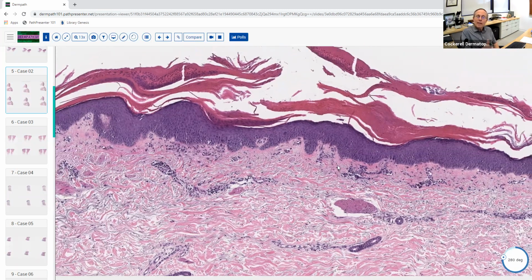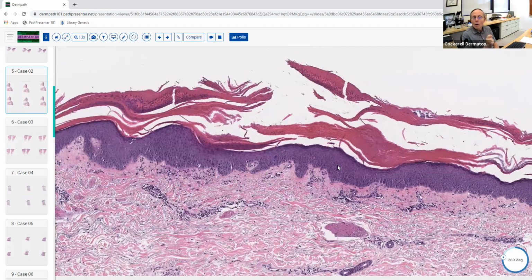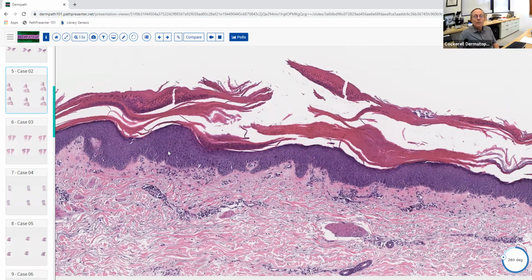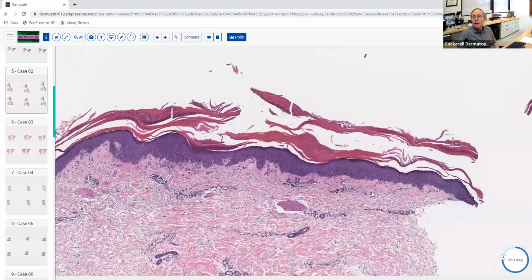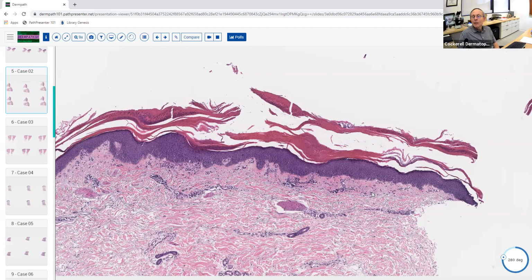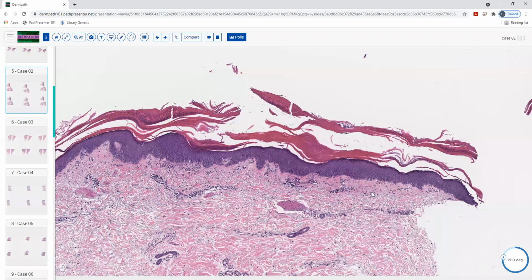So we just talked about the scabies mite with that little burrow. What about the cornified layer here? So this one has more of kind of like an alternating pattern of parakeratosis. Yeah, it does, and I agree with you. Now, it kind of alternates in both. Sorry, go ahead. You go ahead. I think you're about ready to say what I was going to ask you about. So yeah, it's alternating in both the vertical and horizontal.